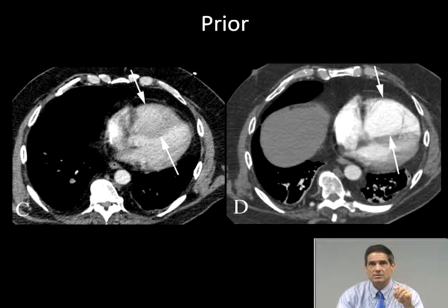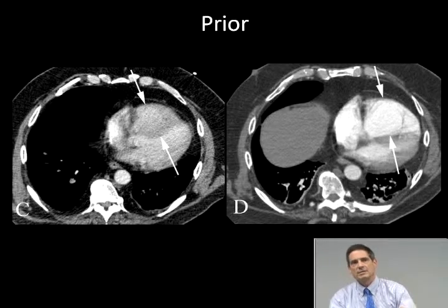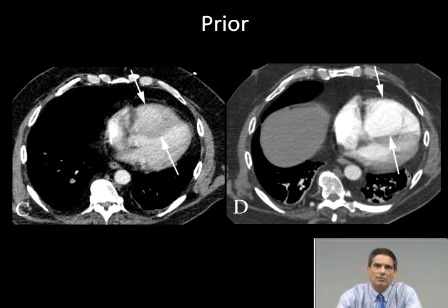embolism. Now this picture shows you on the left that the right ventricle several months before has normal size, whereas on the right, with the pulmonary emboli, the man has a dilated right ventricle. That's a poor prognostic sign, as I noted before.